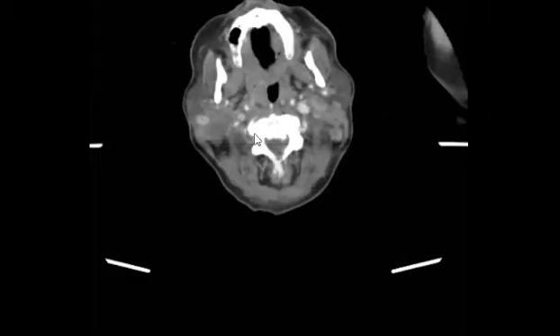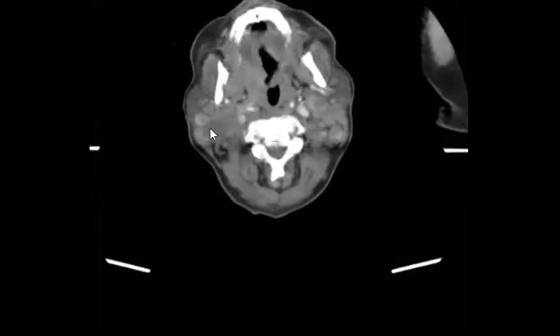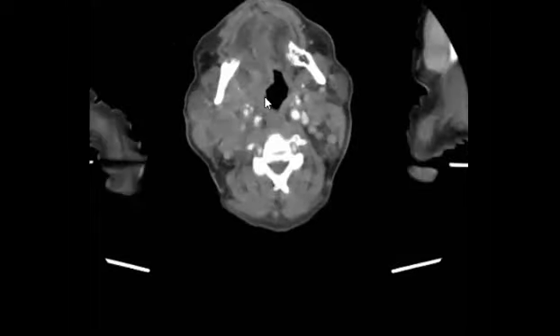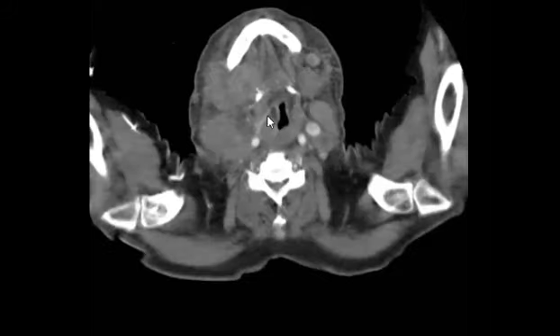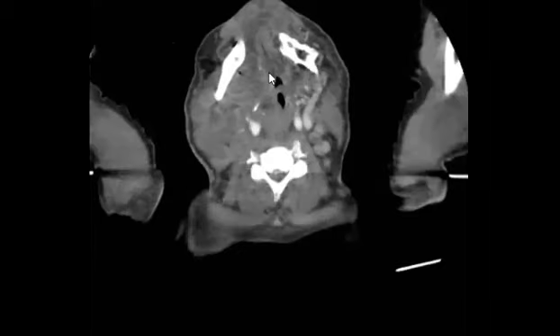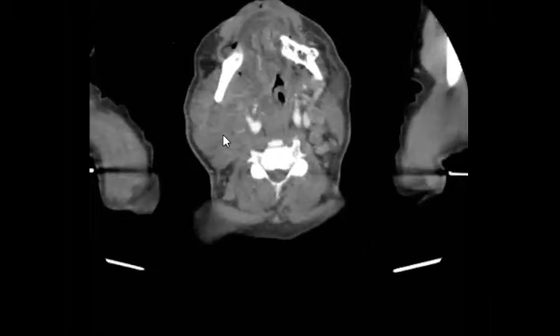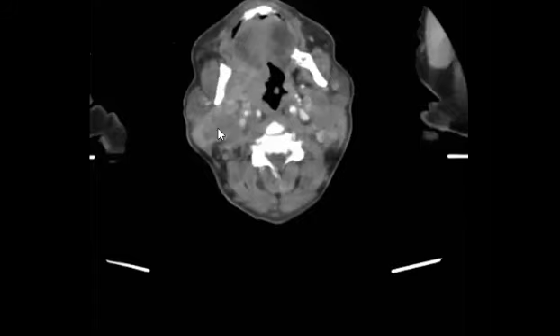But some depressing point is that there is a big problem here. I see that Nermeen already said there is a parotid lesion. Yes, it can be a parotid lesion, but there is a glottic and supraglottic mass, and there is soft tissue here and here, almost in all parapharyngeal spaces.